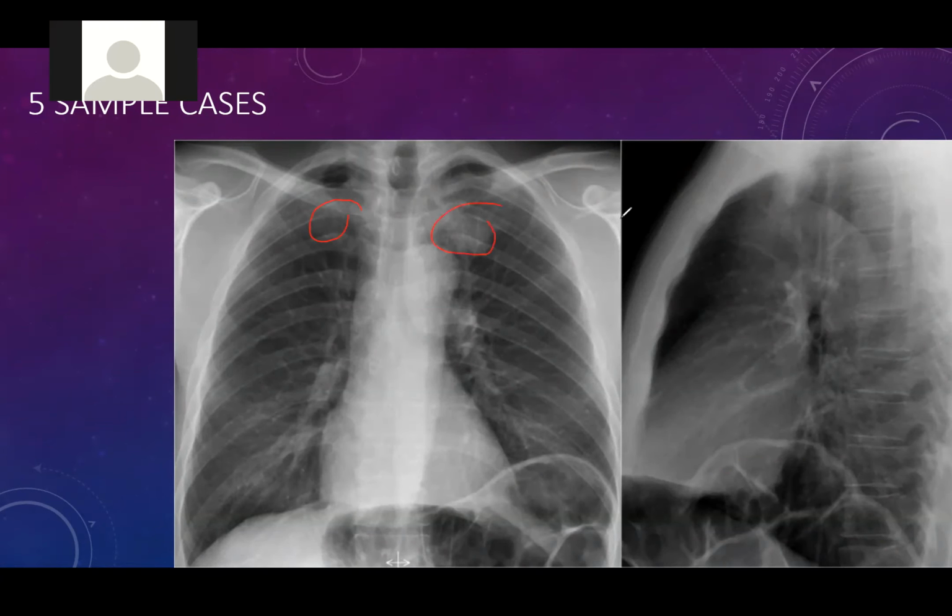There is a nodular lesion in the upper part, in the left lung. Great, doctor. I congratulate you. You are the first person to say that. It intersects with the first rib, so it can be something on the first rib as well, but there is definitely some asymmetrical appearance here. If I look at the lateral graph, there is something else. I can see something faintly. So there is a high probability of a mass lesion on the lung here. Very good, doctor.